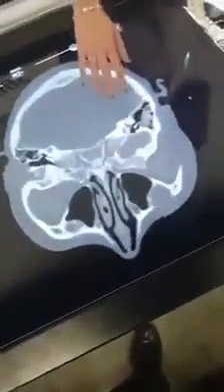And what's most interesting to me is you can load in your own patient MRI scan, and from there you can get a 3D model of what you're seeing. So here we have a post-operative scan of a patient with a brain aneurysm, and this is the actual CT that was provided. You can go ahead and slide through the CT and see exactly where the clips were placed as well. So if I go down here, it'll show where it is.